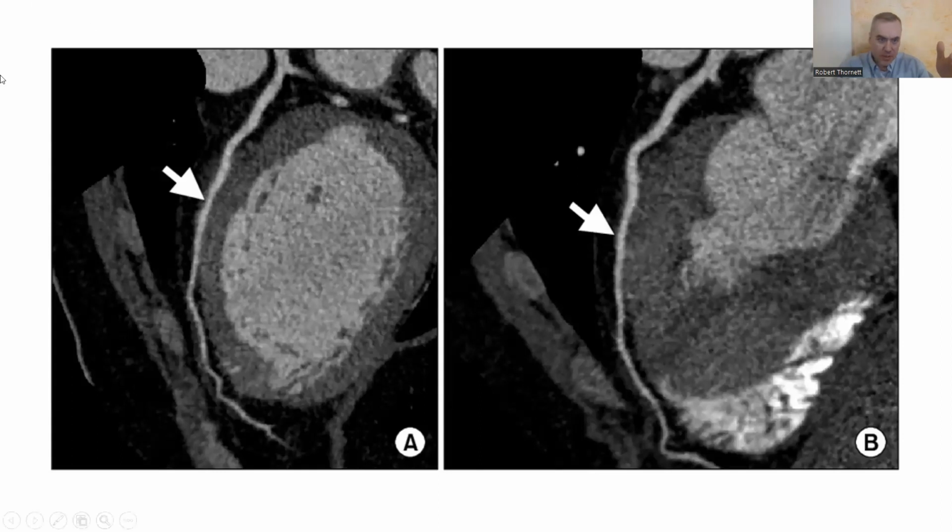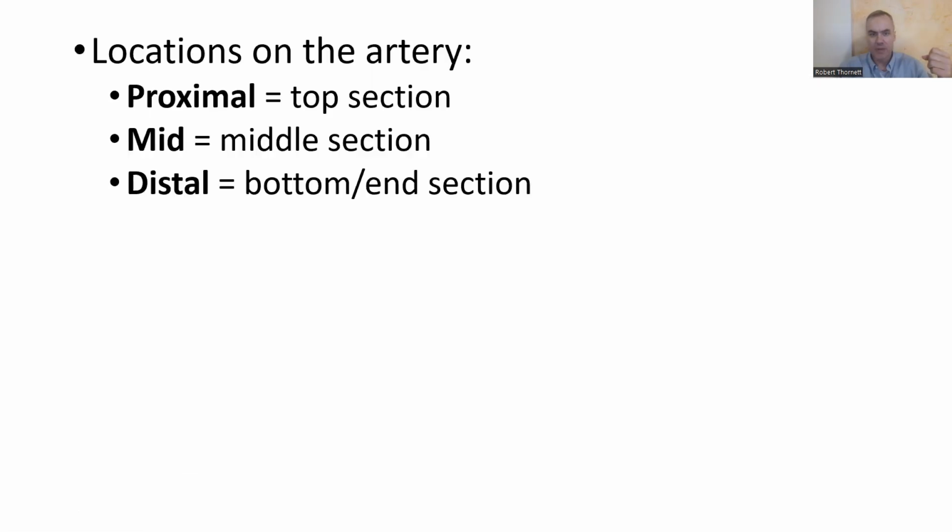You can see that, for example, the artery is nice and clear as it comes down. It's pretty clear here. But then in the middle, right about here, the edges of it are not so sharp. It's kind of wobbly in here. It's not so sharp, right about here. And we'll see more of that later. We'll see some really severe ones that are very blurry.